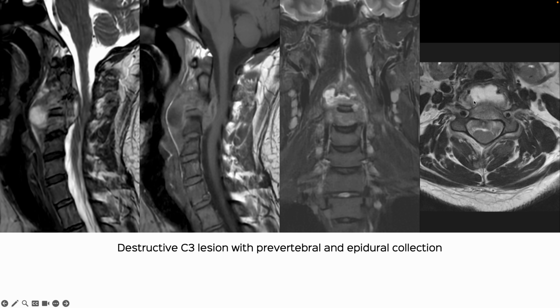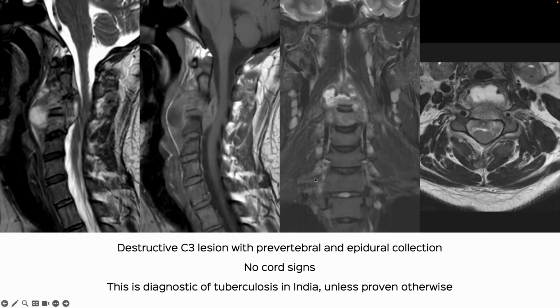There's a nice liquefied area here, no cord signs, and so this, typically in a 27-year-old in India, would be TB or tuberculosis unless proven otherwise. And perhaps 10, 20 years ago, this patient would have just been put on anti-TB treatment, and then you kind of hope for the best.